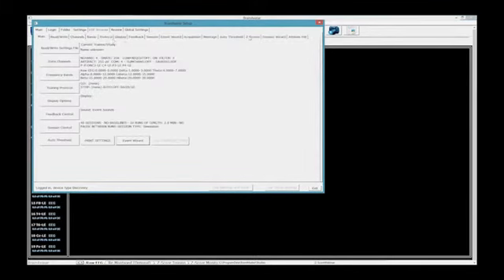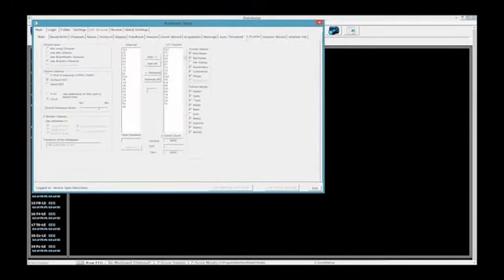Now, to go even further, on the Z-score screen you can choose not only how many channels you're training, but what components you're training. As you can see right now, we have trained values of absolute power and relative power. There are no power ratios, so that's why that is checked off. You have asymmetry, coherence, and phase. So if I did not want to do, for example, phase, if I check this box off, you're going to notice that right there the changes. It goes from 49.59 as total surface Z-scores to 34.20.